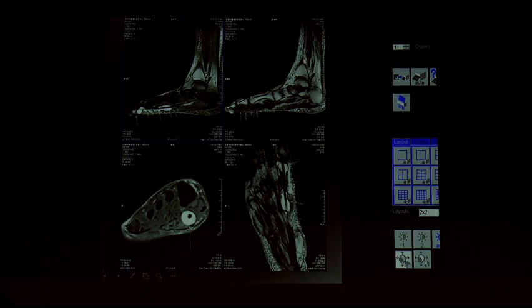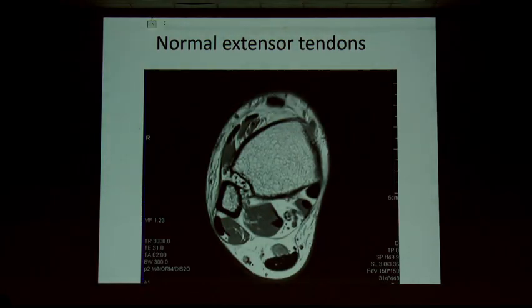And this is FHL, the second, you can see the FHL, it is tenosynovitis, stenosing tenosynovitis. Whenever we are seeing septations, this is septations within the FHL, and you can see the tenosynovitis. This is classical features of tubercular etiology. Whenever we are suspecting tubercular etiology, fine septations, loculations, and rice bodies. If you are carefully seeing, small rice bodies will be seen along the synovial thickening. They are all very classical features of tubercular stenosing tenosynovitis. It is occurring in the FHL tendon.